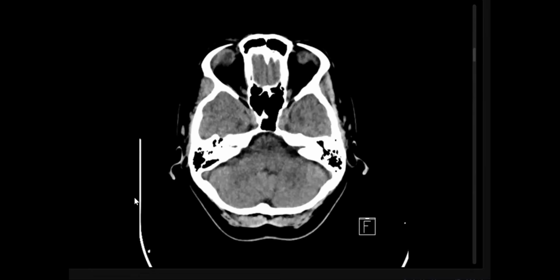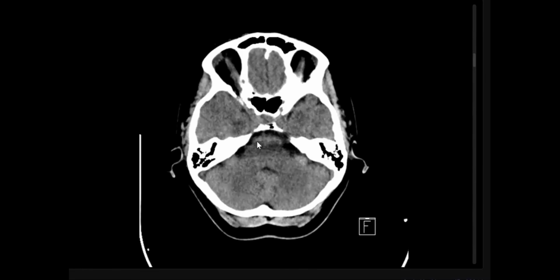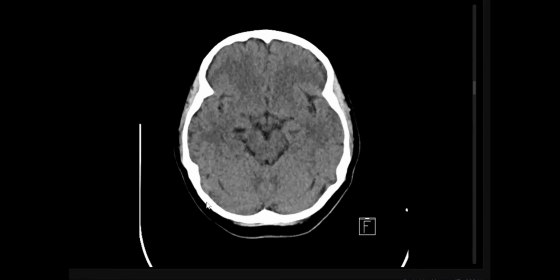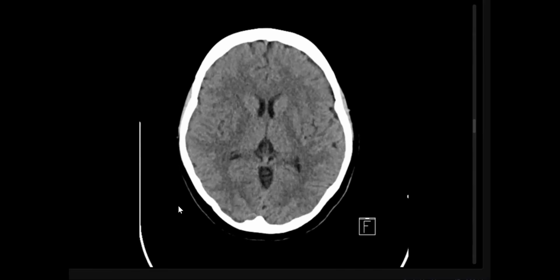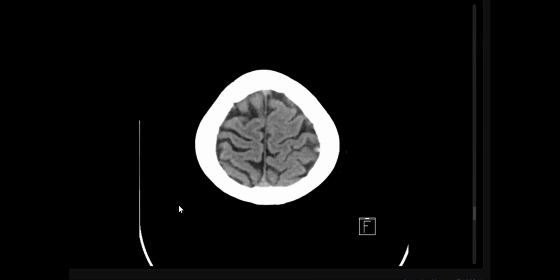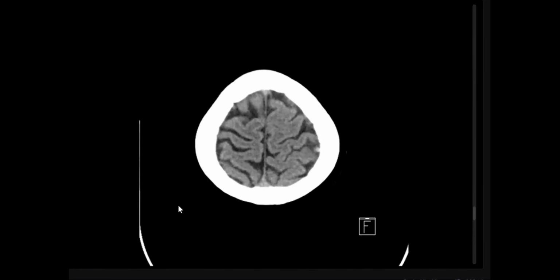What else? I'm looking at the pituitary for any lesion, like Sheehan syndrome. Excellent, also related to pregnancy. What else? Looking at the brain stem and ventricular system, so far I couldn't find any significant hypo or hyperdense lesion. So looking again at the vessels, a middle-aged lady, for example postpartum.